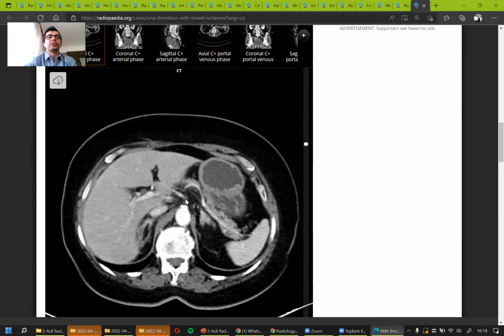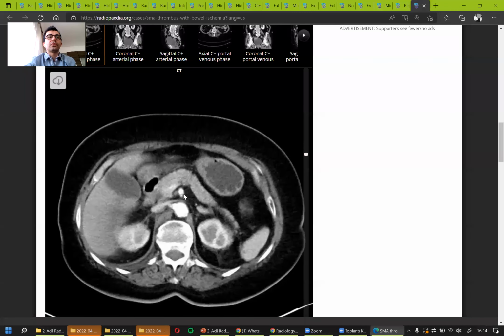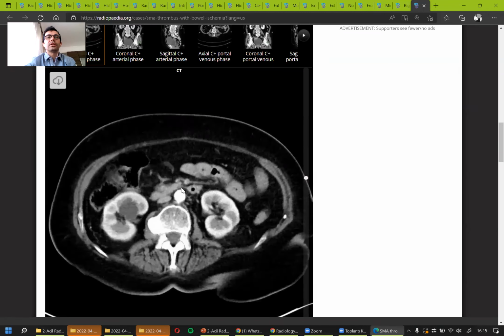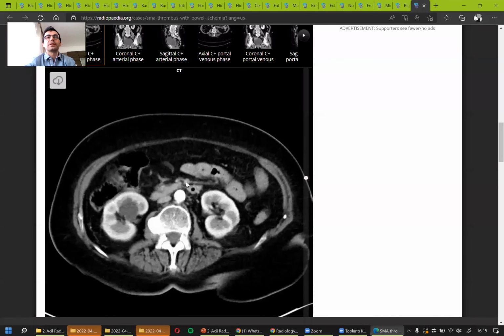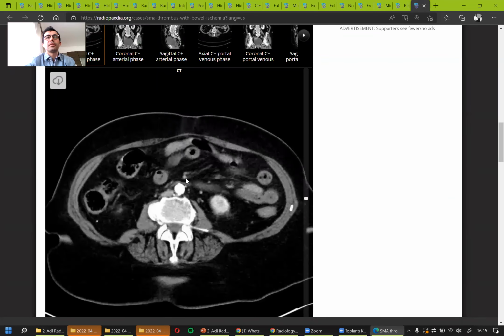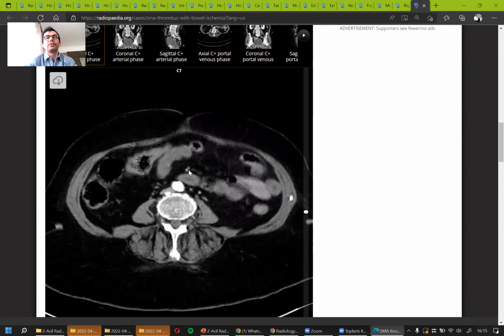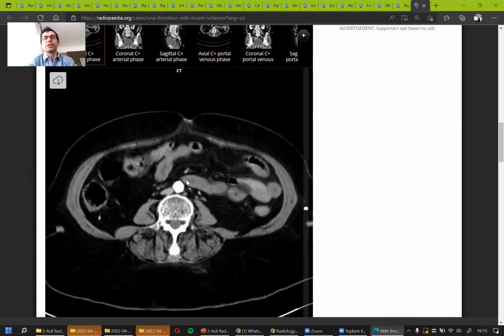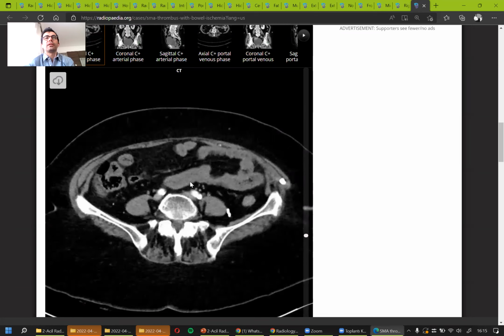As in a case of pulmonary emboli, as you remember, there was some thrombus inside the artery. This is the superior mesenteric artery of the patient, and after some time, the brightness suddenly disappears, like there is some thrombus inside the superior mesenteric artery, obviously. Afterwards, it gets filled up with contrast again, but this slows down the circulation enough so that the bowel walls here are quite thicker than normal.